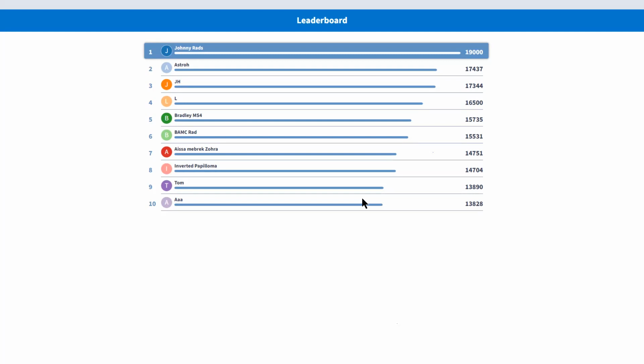I think if you were to get a question showing ground glass appearance of all the bones of the skull base, and it's markedly expansile, and they have any history suggestive of McCune-Albright syndrome, then you would be more confident of your answer that it is fibrous dysplasia and not Paget's disease. I think another thing that would help might be the age. That case was actually from a younger person, I think in their teens or early 20s, and that would favor fibrous dysplasia as opposed to Paget's.